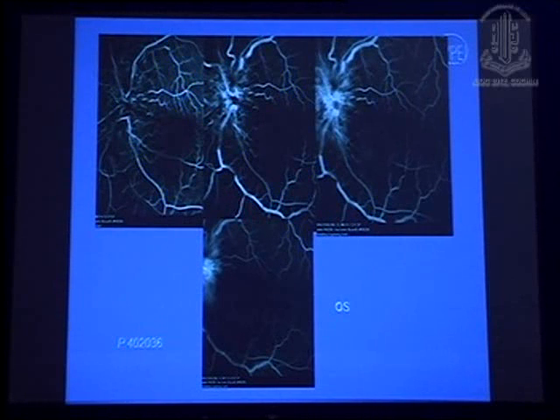So it may be a peripapillary choroiditis. Why are you saying it is choroiditis? Because it's early hypofluorescence followed by late hyperfluorescence. Excellent. There will be an initial hypofluorescence followed by hyperfluorescence as time progresses.